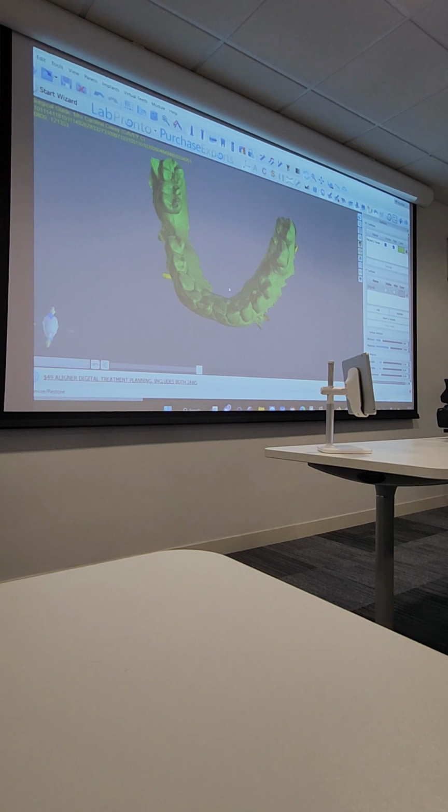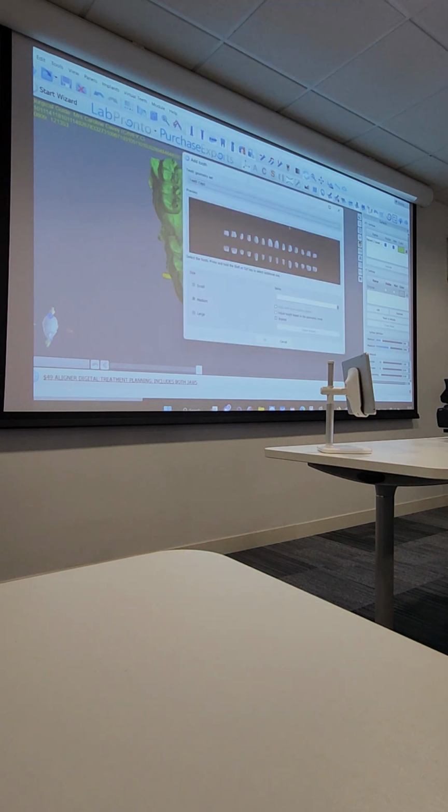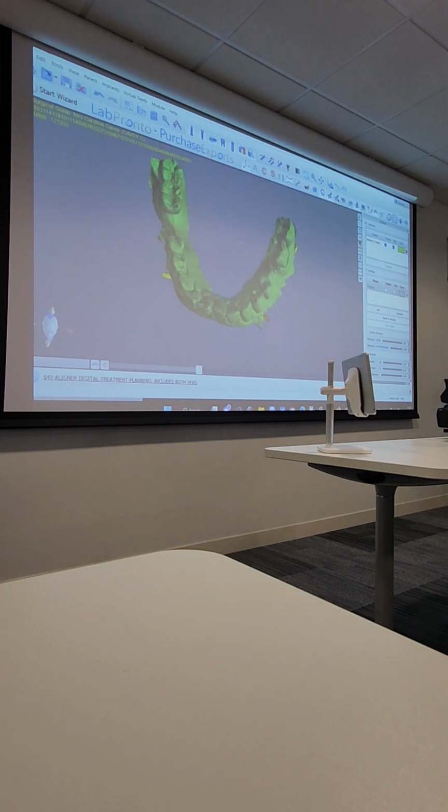Remember PDIP. We start with the surface, our tooth surface, first. You go up to the top. You pick virtual tooth. Add a tooth. Increase the surface. Pick your tooth, the tooth you're replacing. Press OK. Implant list. Gives you this. Guide fabrication. Click in your position.